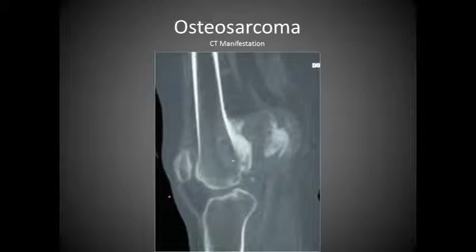Here we have another osteosarcoma, and notice that we have this possibly in some type of joint capsule, and we have the growth here, and we have extra growth out here.